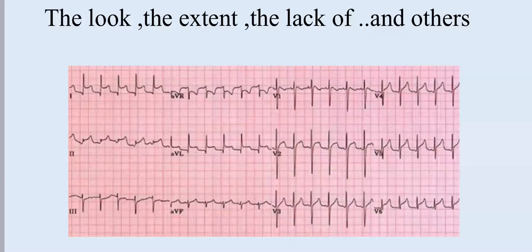Okay. Again, I'm going to stress the clinical features, and the fact that ECG is not always easy and sometimes really misleading. This is a normal, benign repolarization. I know it's an extreme form of early repolarization, but this is no more than early repolarization. So sometimes it looks so significantly abnormal to the extent that you might take a patient to the cath lab, okay? But it's early repolarization leading to ST segment elevation of that much.